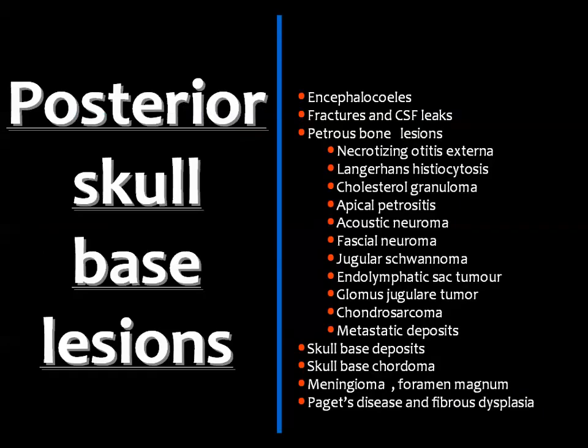Then most of the lesions of the posterior skull base are related to the petrous bone, and most of these lesions have also been discussed with the issue of the petrous bone, but we will emphasize these lesions once more.